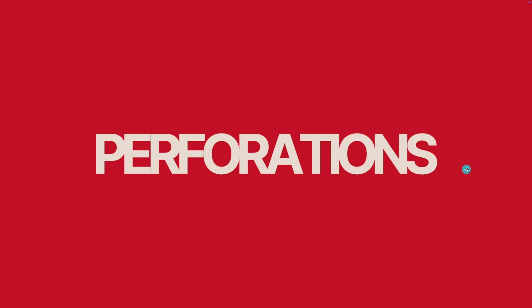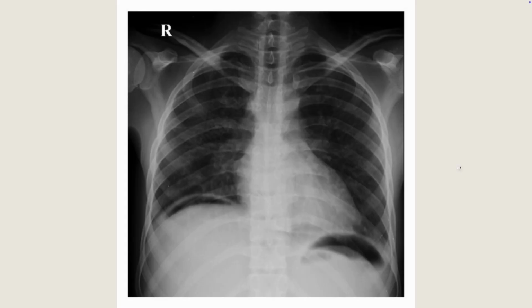Okay. So once we've talked about obstructions, we need to talk about perforations. Perforations are fairly easy to make a diagnosis of. You'll see this air under the diaphragm, which should be a telltale sign for you. You see the dome of the diaphragm, and you see this black shadow underneath it, which is the air under the diaphragm.